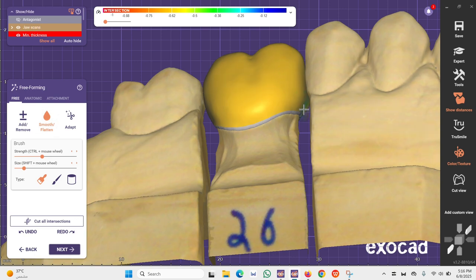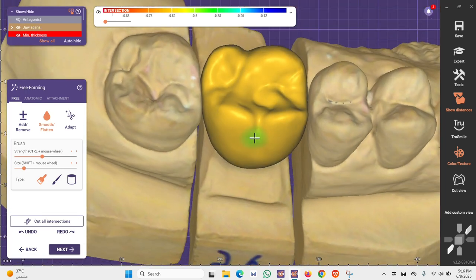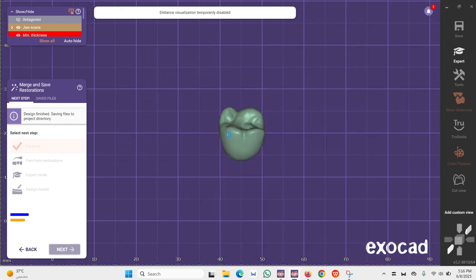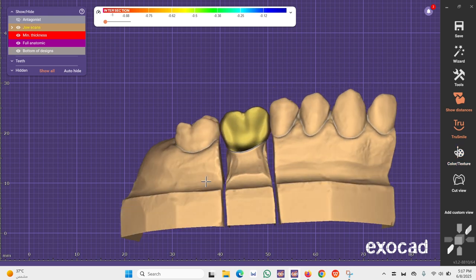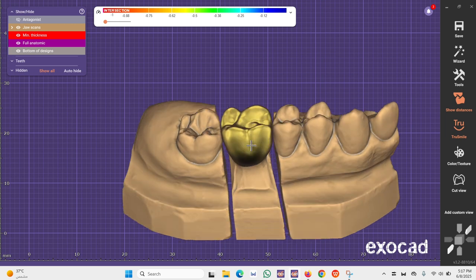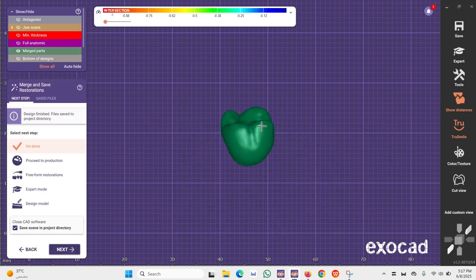And we're just going to smoothen out all the surfaces. And if you can't see between the teeth, you can press shift and control, but here we're done. And now what we can do is hit either true smile or get the color coding. To do this, you want to hit your right mouse button or go to tools and you can select from there.